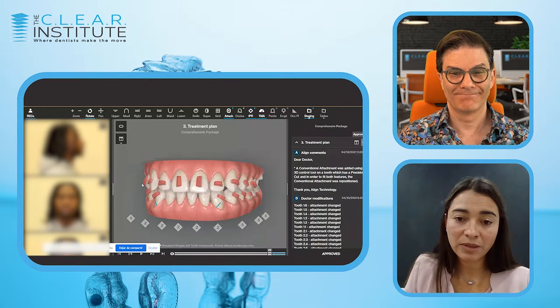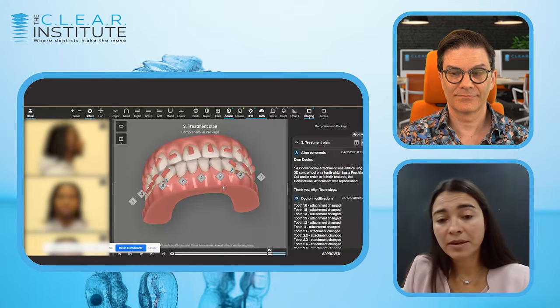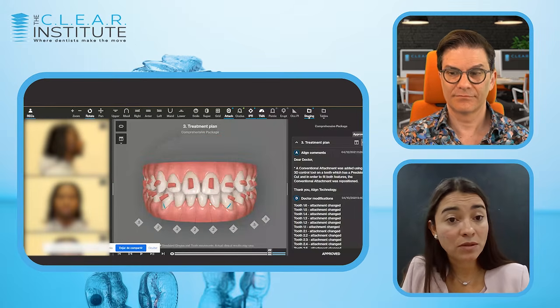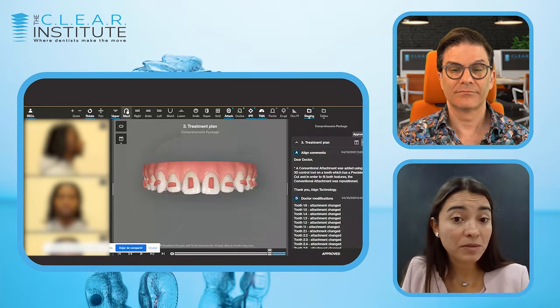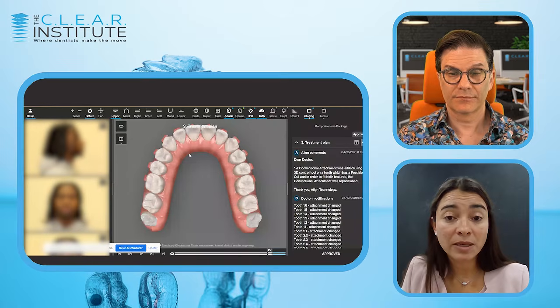Yes, absolutely. And the recommendation for this case will be to make sure to plan for fixed retention, because in the upper arch, this diastema is going to want to come back.